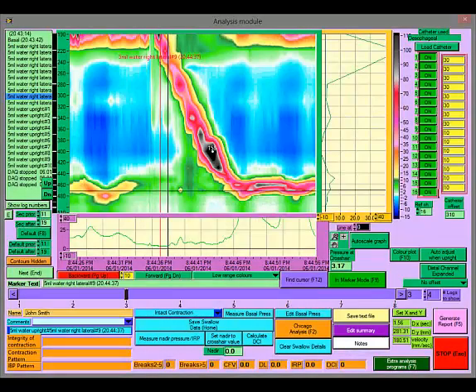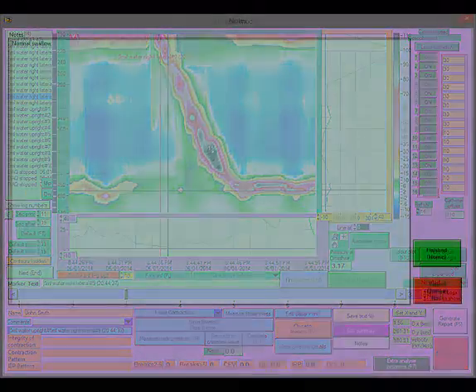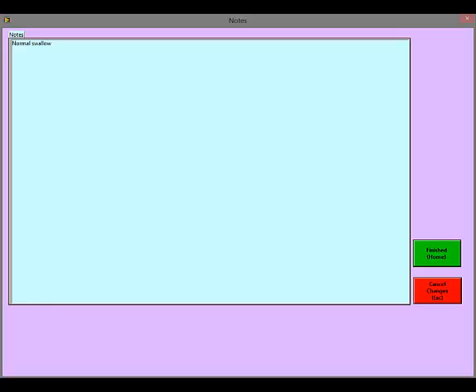You can enter some notes to be saved with the data file to be accessed again later. To do this, click on the Notes button. Enter the text and save it. It will be there when you view the screen next time.